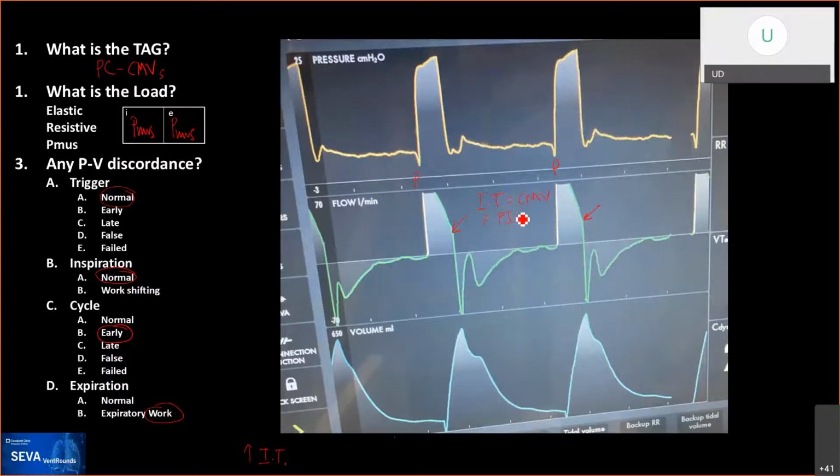If I set it too high, normally it's set on the ventilator between 25 and 35, but I could have made a mistake or just by choice chosen 50% or 35%. So I could be cycling early also under those circumstances. Does that make sense, what I'm saying?